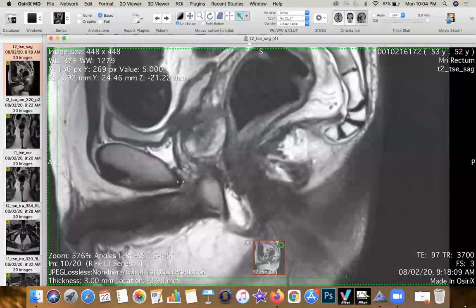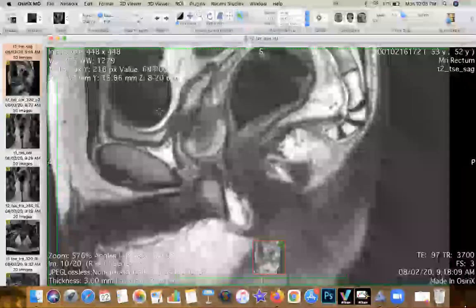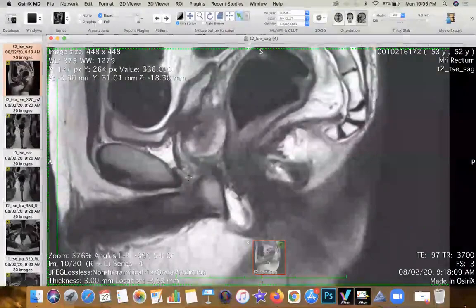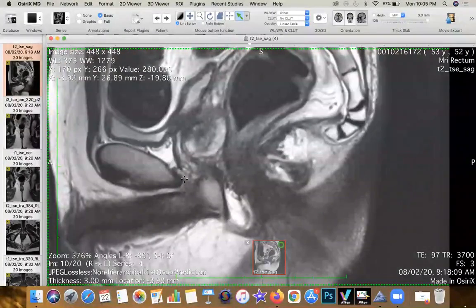No, there is no length, but there's a key criteria when you're looking at pelvic floor descent. In women, when you have the anterior and posterior compartments, if the descent of the pelvic floor is by 3 centimeters, for the anterior and middle compartment you subtract about a centimeter and you give the true value. If it's gone down by 6, you subtract 3 for the posterior compartment. So for the anterior and middle, you subtract 1. And for the posterior, you subtract, I think, 2.5 or 3 centimeters before you give your measurement.